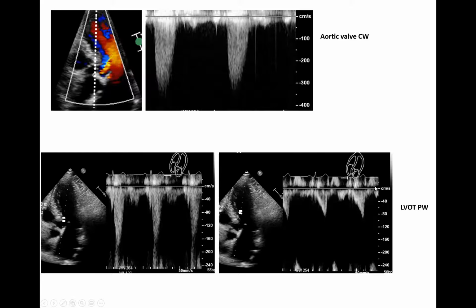Another problem that they had in aortic valve calculation, this is the LVOT velocity. They measured it as 1.6. And so they came out with 1.6 and 3.2. The dimensionless index is 0.5. So they calculated it as, you know, barely moderate AS. But they made a mistake. Whenever you want to assess severe AS, you want to assess the LVOT velocity.